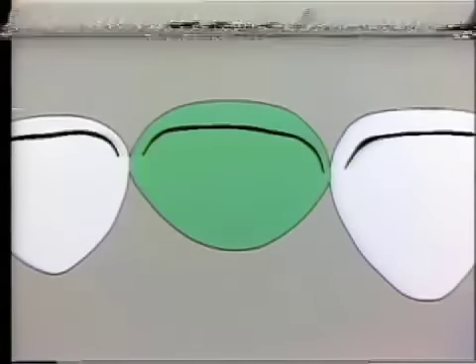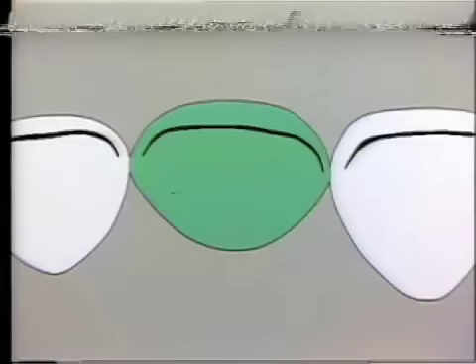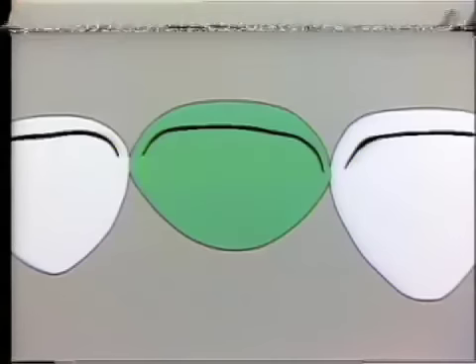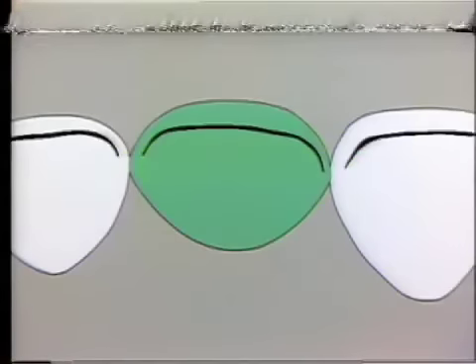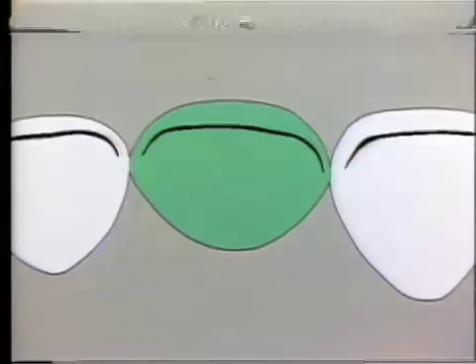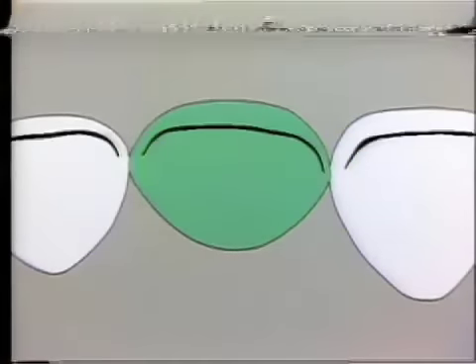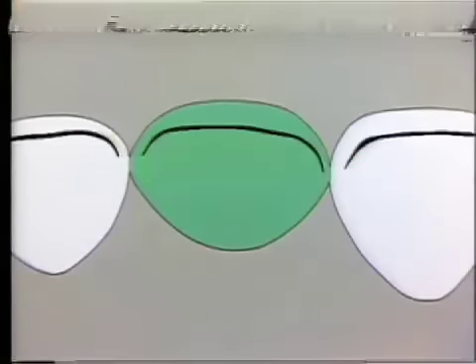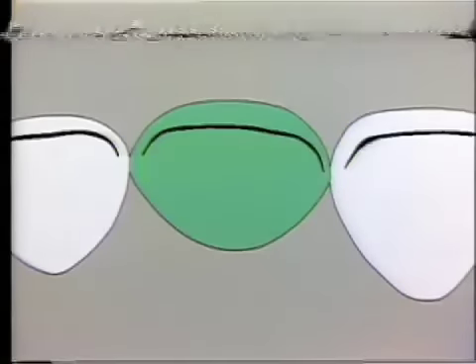It, of course, blends in with the reduction of the cervical third of the lingual surface, and the two operations are carried out in one procedure as the Pontic form is developed on the lingual surface. The labial surface is left unchanged because of the need to maintain the exact anatomical form there in order to maintain aesthetics. So far as the proximal embrasures are concerned, the labial surface is not changed.